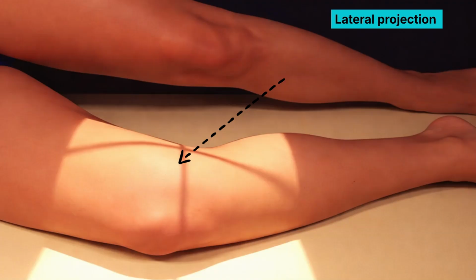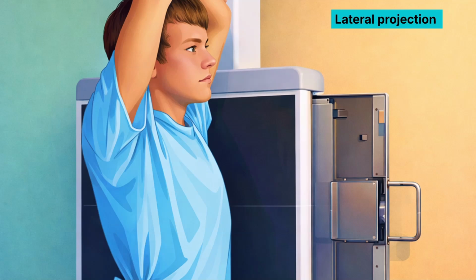It is important to note that lateral projections can be taken from one given side to the other, or vice versa. This applies to the chest, to joints, and to many other regions. The lateral view doesn't add information. It reveals information that was already there but hidden.